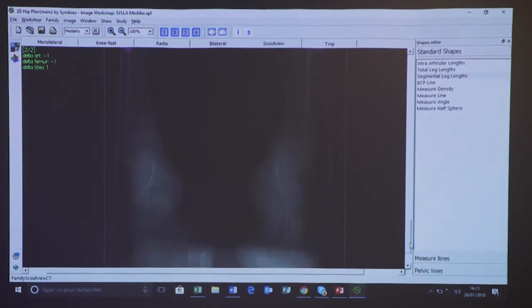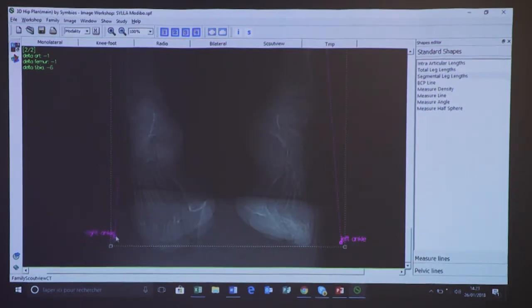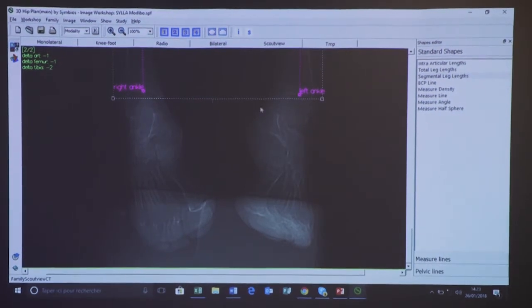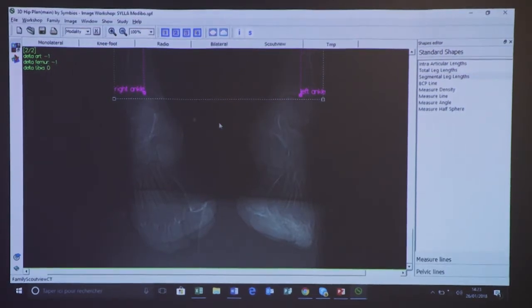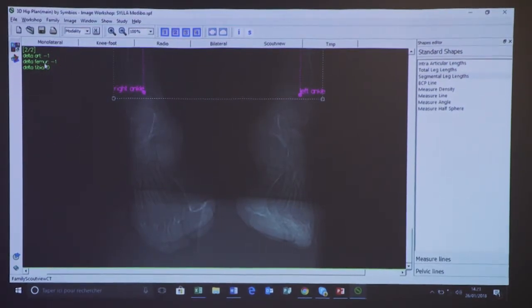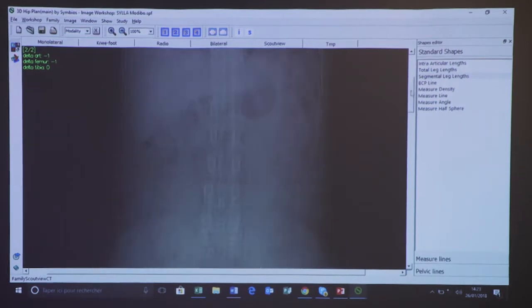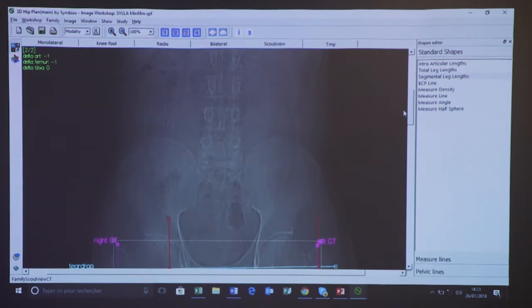And the ankles, you can see that this guy has no major lower limb discrepancy. It's -1 and 0, and -1 inside the joint. It means that he's perfectly equal. So with this guy, you have to be very careful because he will not tolerate a huge lengthening so well.